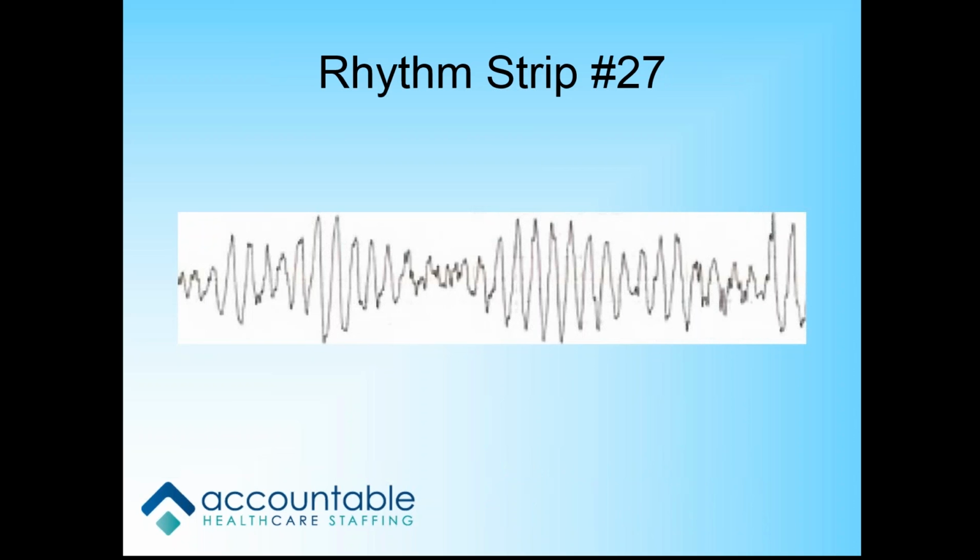I know that's torsades. Perfect. What am I going to do for it? That I don't know. You're going to give magnesium. That's the answer they want for this rhythm. This rhythm is on your test, and they want you to give magnesium. Okay. I can remember that.